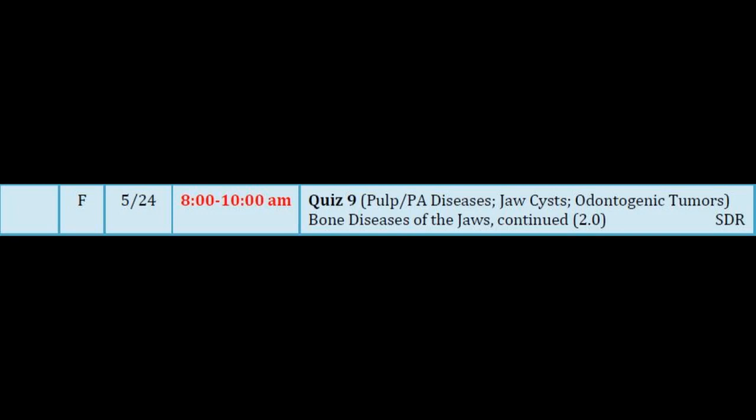So we move on. Can you find the lesion? All right. So this is a panoramic radiograph from days gone by when we had lots of artifact in panoramic, particularly in the midline, and all of this is artifact as part of the process. So that's not the lesion. This is the lesion. And it's oval and it's well defined. And that little thing there is also artifact, and this area of generalized lucency matches this generalized lucency in his artifact. So the lesion is this. Do you see it? Okay. Now do you see it better?